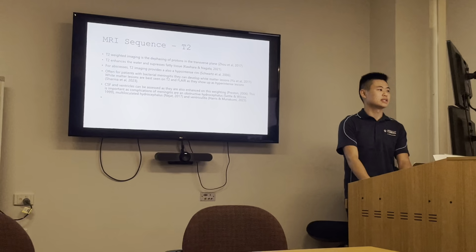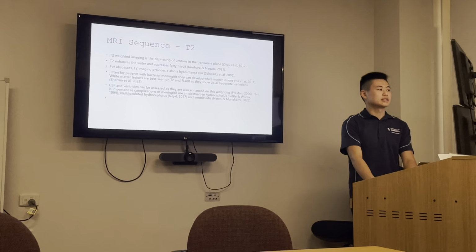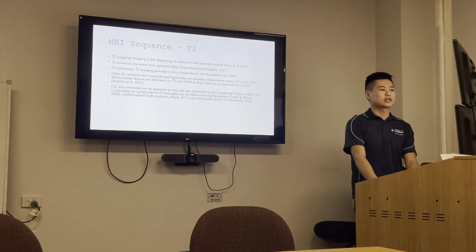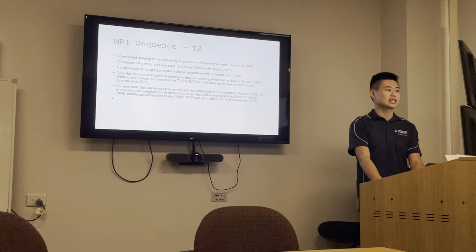CSF and ventricles can be assessed as they also enhance on this weighting. This is important as complications of meningitis include obstructive hydrocephalus, multiloculated hydrocephalus, and ventriculitis.